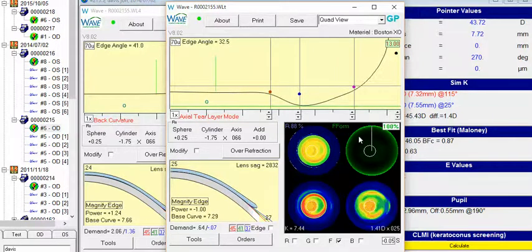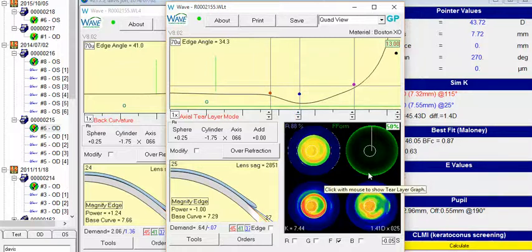And then this vertical meridian, put in the 50th percentile, and I'm going to try to click up on that one to increase the clearance there in that vertical meridian. And since we're in freeform, we want to do it in the inferior one, just get a little clearance there so you have a tear exchange.